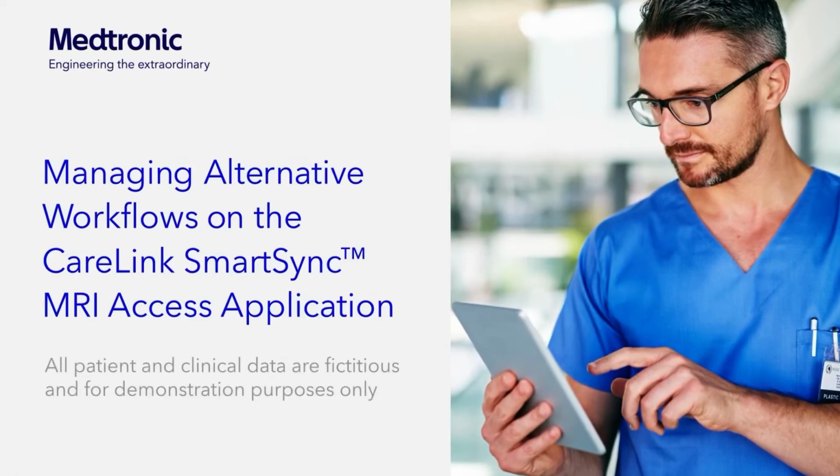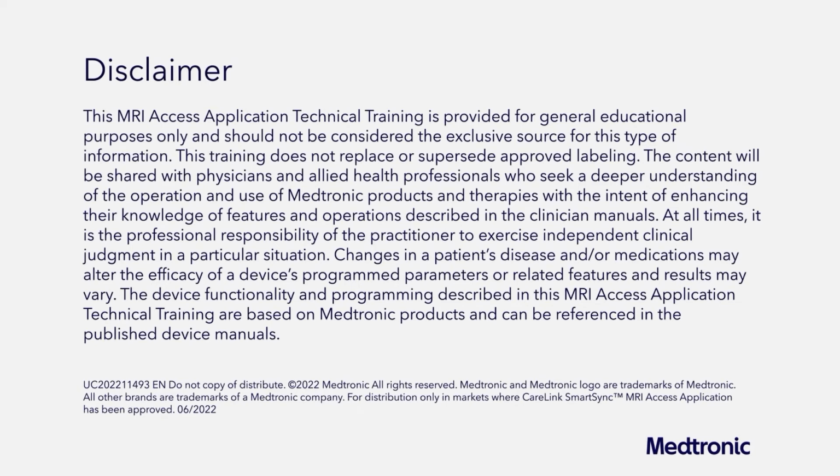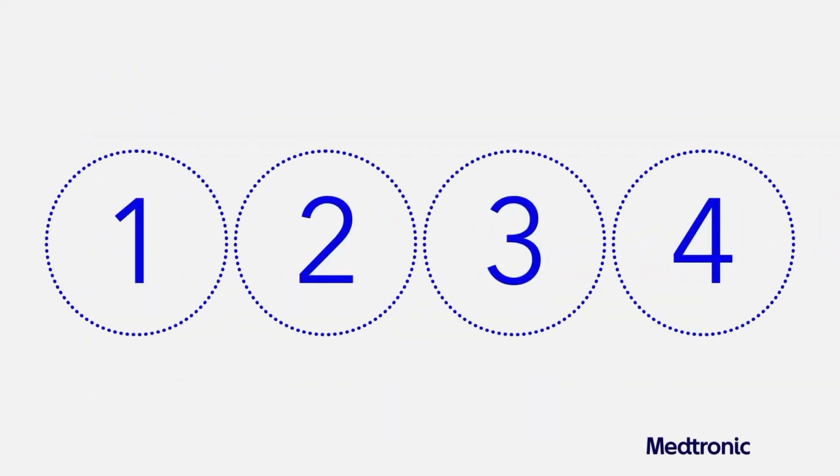On the CareLink SmartSync MRI Access application. This video explores 4 alternative workflows on the CareLink SmartSync MRI Access application.